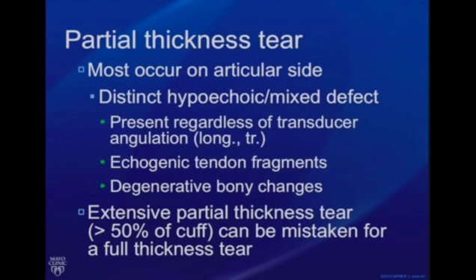An extensive partial thickness tear in which more than 50% of the cuff is involved can be mistaken for a full thickness tear, and we are not very sensitive in differentiating between an extensive partial thickness tear or a full thickness tear.